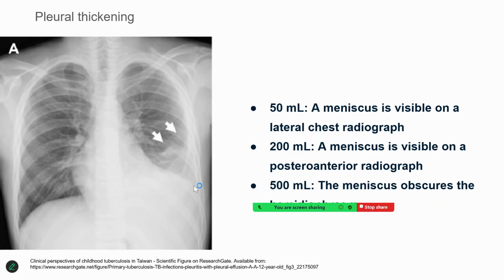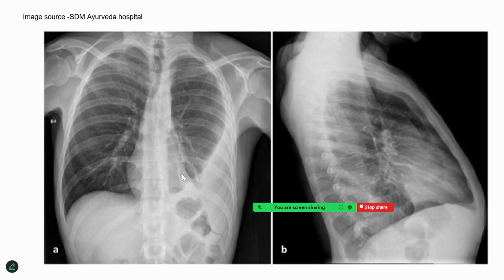But when you put in the needle and then aspirate, you'll know about the fluid situation. So in such a condition, ultrasonography could be a better investigation as such. Then if it is 500 ml, that's if one segment of the rib is obliterated by the fluid shadow, then it's considered to be 500 ml. That's how the quantity is assessed.